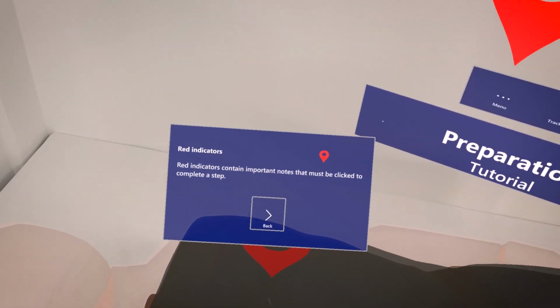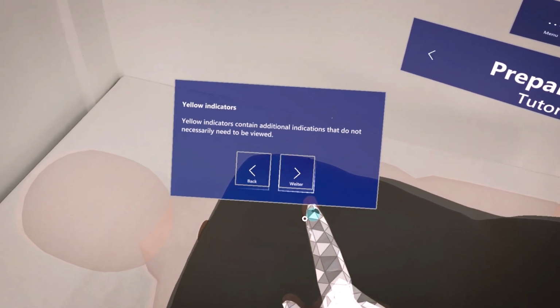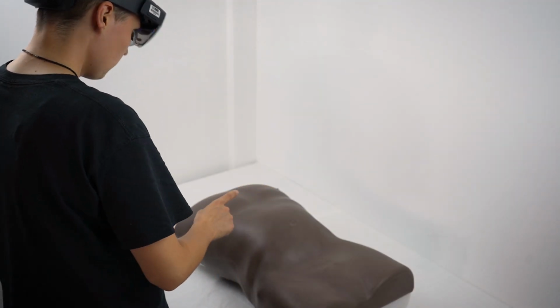The environment of EATR consists of a medical training phantom augmented by an AR phantom and the teaching content. A simple interface allows orientation in the application and in the process. Content is spatially mapped onto the body via pin indicators.